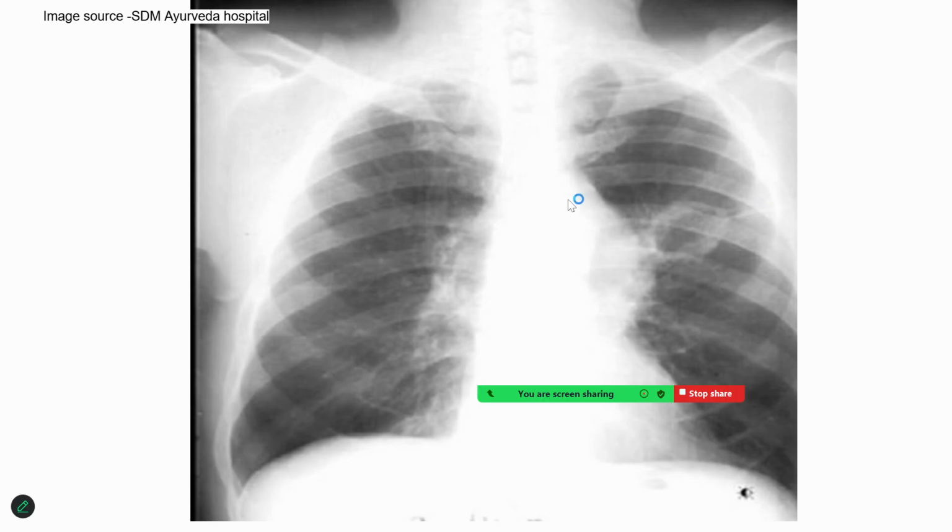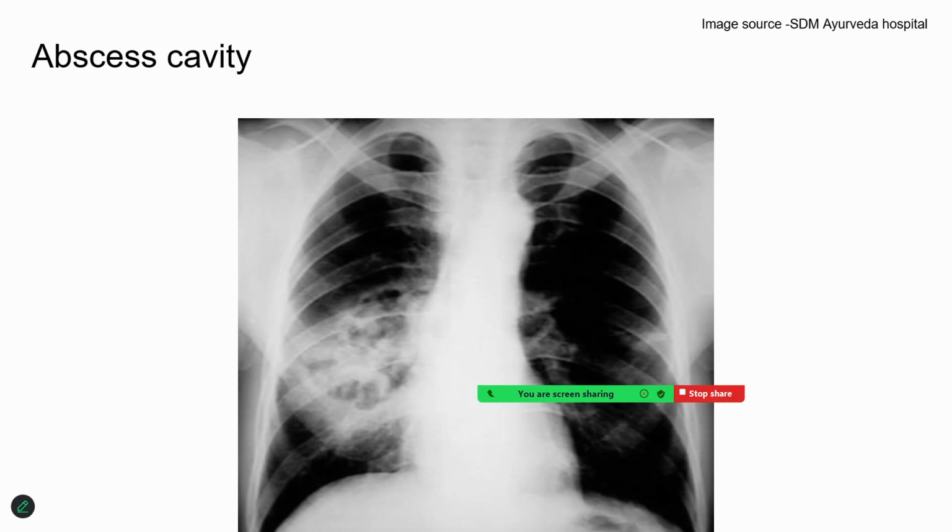Now, here is another confusing X-ray where the lesion could be either tubercular or otherwise. Another important difference in this cavity is that the inner surface of the cavity is somewhat irregular. The outer surface has a somewhat regular feature, which is suggestive of a non-tubercular, purulent abscess, an abscess which has drained out, and then later on the lung abscess can also result in cavities.